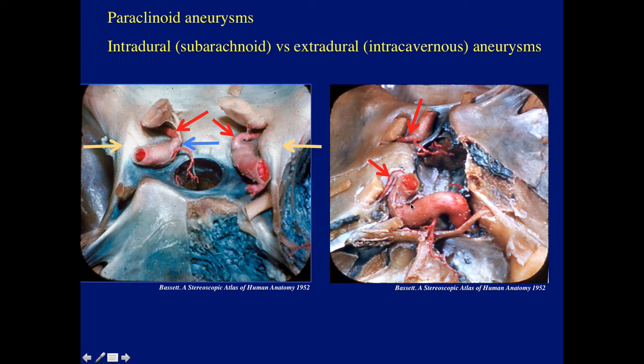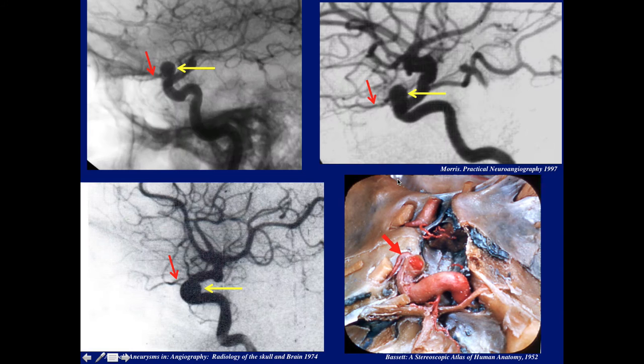This is all within the cavernous sinus. Then it makes an anterior bend coming out of the roof of the cavernous sinus. It gives off the ophthalmic artery. Although this can be a little bit variable, it's still a good landmark as to where the subarachnoid space begins. So the position of the origin of the ophthalmic is a good indicator.